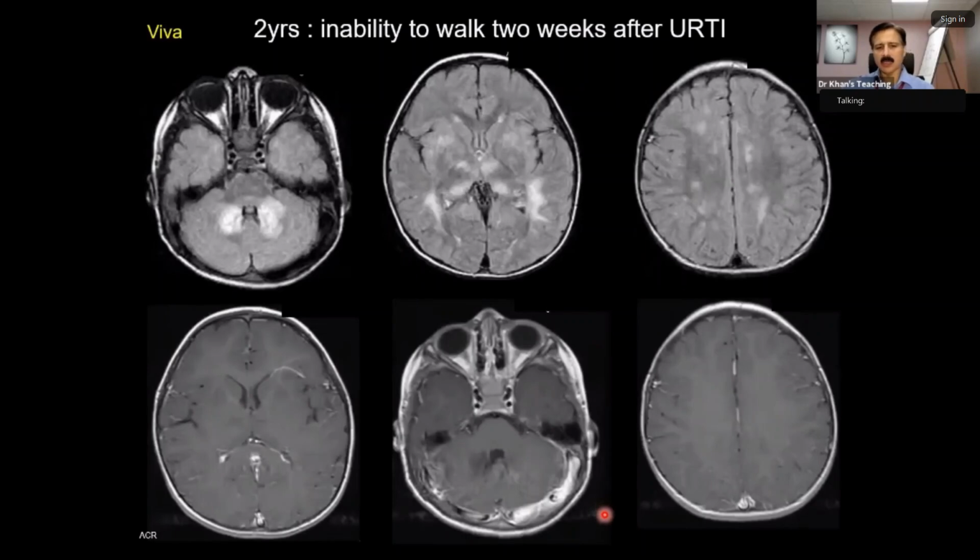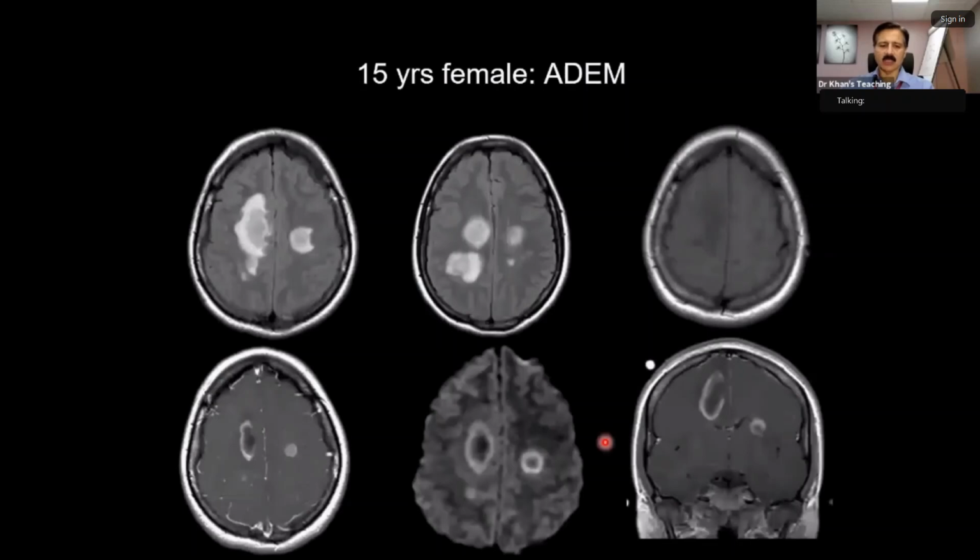And this is what the examiner is going to ask you. Look at the thalamus here. This is involved. Look at the basal ganglia, deep gray matter. Look at the dentate nucleus here, deep gray matter. So this increases your confidence. Of course, this is a giveaway. Maybe the examiner will not tell you, or you might like to ask it. Please remember, in the real world, for many of these patients, the history is too vague, and at times they just forget that they had something like this.